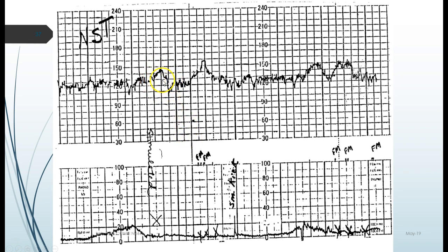That is not part of the baseline. This is not part of the baseline. This is not part of the baseline. Right here is our baseline. These little FM marks right here, that's fetal movement. Either mom said she felt baby move, or the nurse standing at the bedside saw or felt baby move, and they put it on the paper.